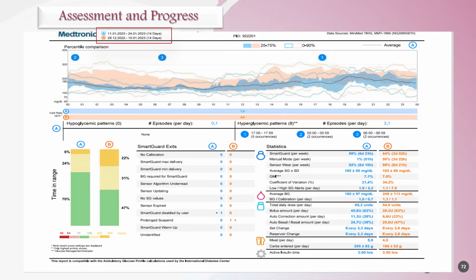Okay, so you will see the time frame, and of course, when reading the report, make sure that your colleagues downloaded the right person, assuring it by the right patient number or the name written above, which I hid because it is for educational purposes. So like any report, make sure that you choose the right person and the right segment of time you want to discuss, because sometimes you will find previous downloads, and the educator or the one responsible for downloading the data did not do a new one. So make sure that you are working in the right time segment.